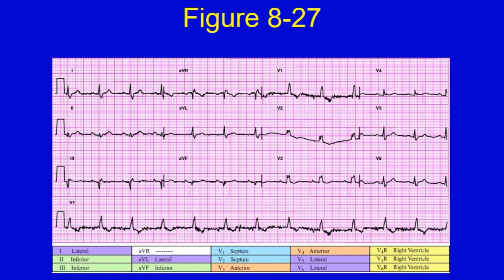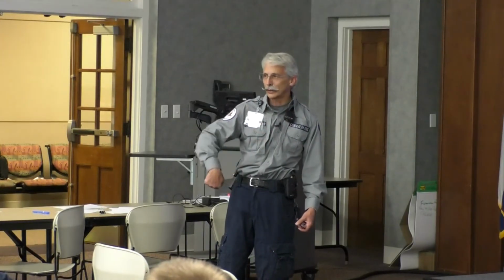The nurse showed me that one day. We were not looking at V1. We had not done a 12-lead. And she goes, oh, look, a right bundle branch block. I went, whoa, stop. How did you know that? She goes, this big swoopy S wave down here. And there's a big swoopy S wave here because it's moving away, and anything moving away is downward, and it's moving away slowly.